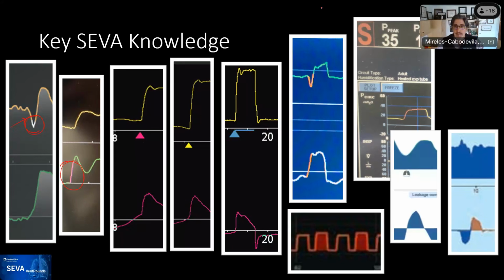The sixth example, this one over here, is the CareScape GE ventilator, and you can see a change in color, again, signaling, and it doesn't tell you if it's pressure or flow. I presume that this is pressure just because of the amount of activity that you have to do, but I cannot tell by the color. The next example up here is another ventilator that is coming out of the market, but still pretty available all around the world, is the Puritan Bennett.